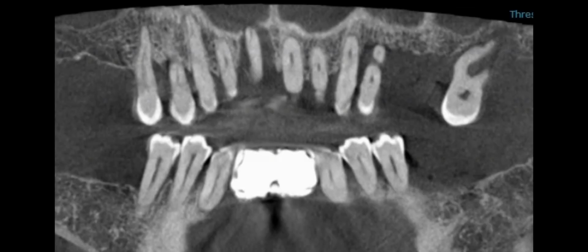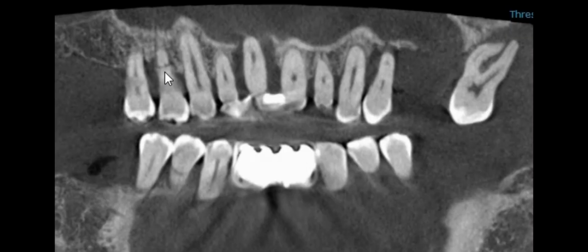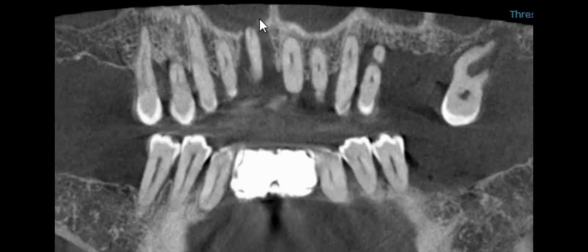If we look at yet another cross-sectional 3D X-ray image, you can see the bone destruction over here, and this here is a root fracture because the tooth was so poorly supported at the top, and you can see the bone loss very significant here. The front tooth here, you can see the bone is totally lost around it, unlike the teeth that have bone where it's all white around the root. These have lost a reasonable amount of bone, but they can be kept for a prolonged period, and so we aim to maintain those.